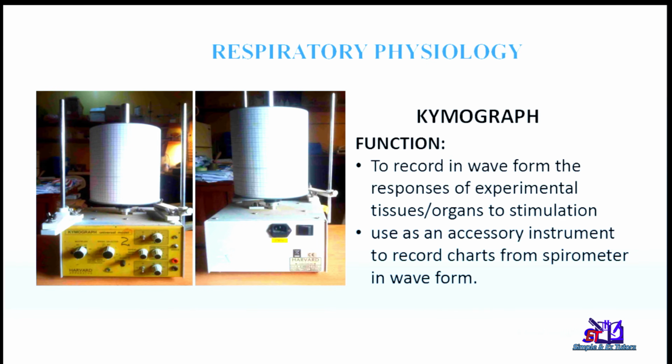On the list is Kymograph. It's an essential instrument that is normally used in respiratory physiology as an accessory instrument to record charts from spirometer in wave form.